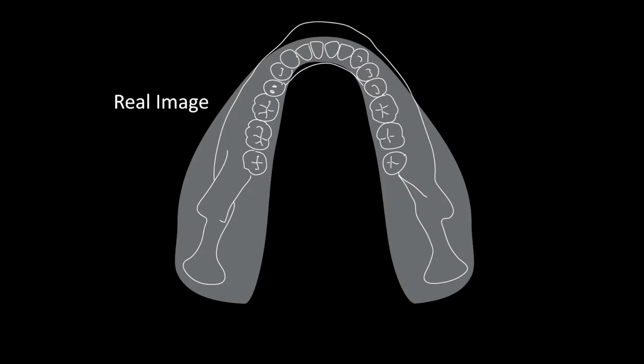In panoramic radiography, the structures inside the focal trough and close to the sensor are real images. There are some structures which are also imaged but are away from the focal trough. To keep the discussion brief, we'll call these images ghost images. So structures inside the gray shaded area are recorded as real image. These structures are sharp and well defined.